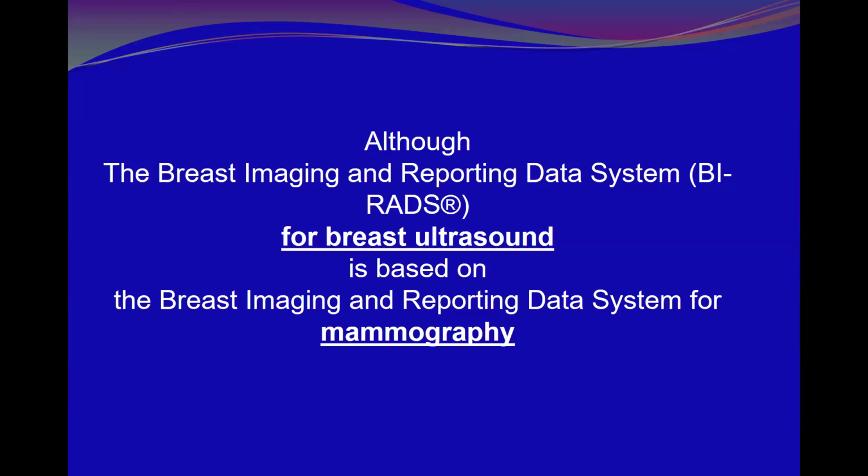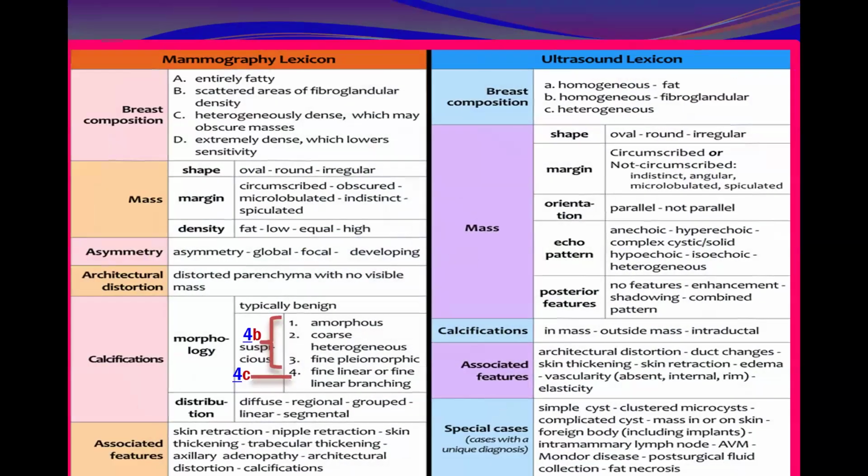Although the breast imaging reporting system for ultrasound is based on the breast imaging reporting and data system for mammography, there are some differences between the two lexicons.